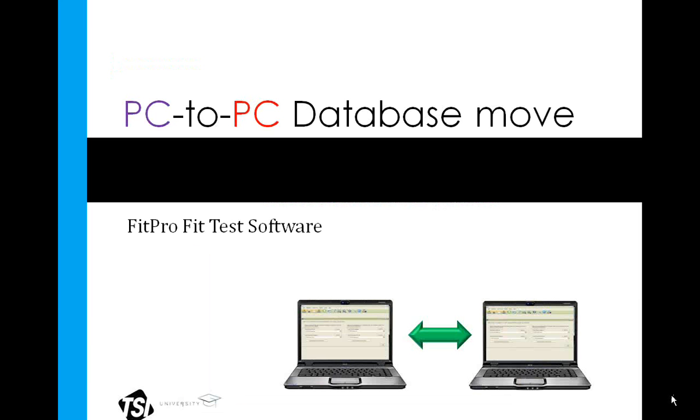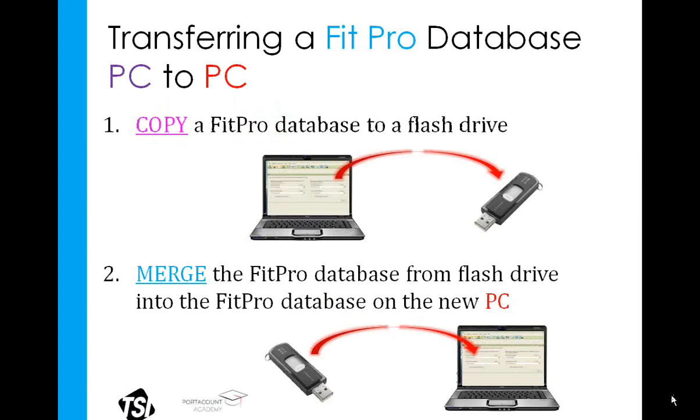Now, I want to touch briefly on transferring a database from one computer to another. I wouldn't say this is very common, but it does tie well into what we just discussed. You would start by using the copy function and copy the database to a flash drive. Alternatively, of course, you could do the split function as well and create that split database on the flash drive.